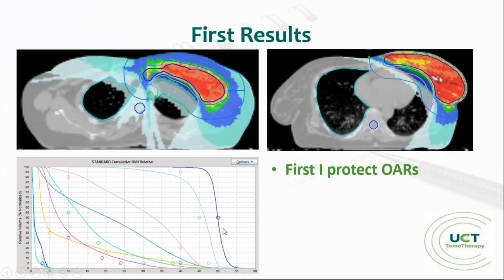So this is the way how I do. This is the way how I think. If someone can achieve better results when he starts to plan from prescribed prescription, I don't know, he can do this, but this is the way, this is, how can I say?